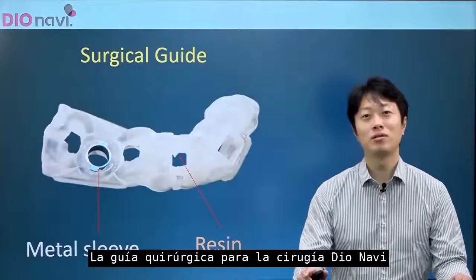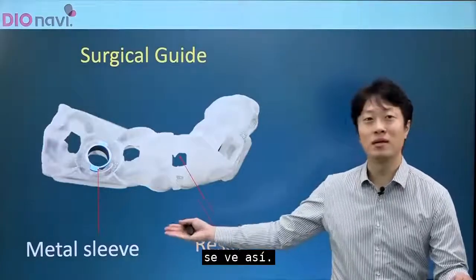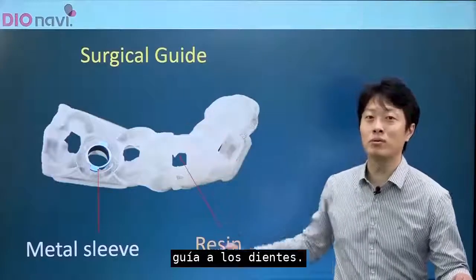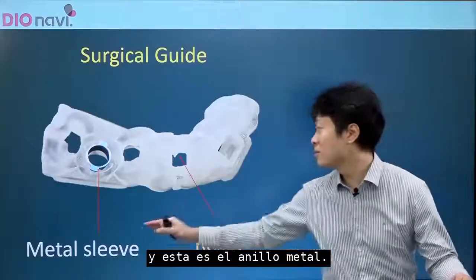The surgical guide for DIOnavi surgery looks like this. This is a resin part to seat the guide to the teeth. And this is a metal sleeve.